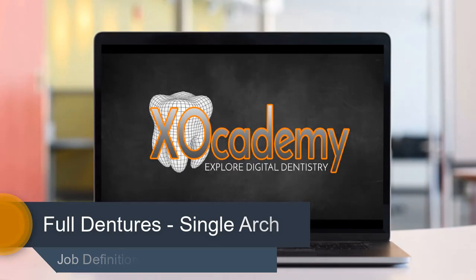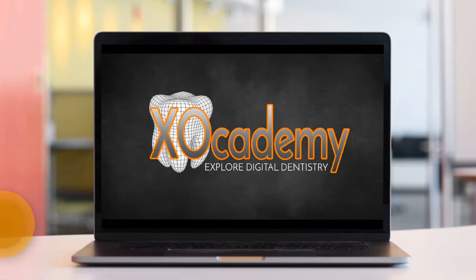Hello Exocad. In this course we're going to design an upper denture using the new updated release, release candidate version 2.4 of the full denture module. To begin, we're going to start DentalDB.